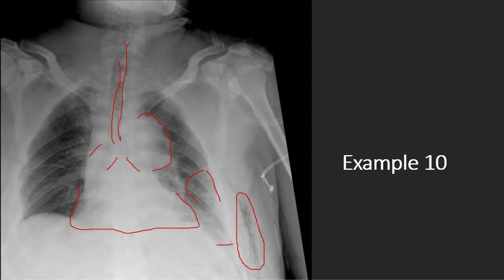You must put the finger or the forceps directly into the air spaces and feel or hear the whoosh of air. You can feel the lung with your finger when you put it in appropriately. And so this was an inappropriate placement because this generated a tract. And you'll see this chest tube went all the way up into the supraclavicular space. Bad times. And then this right here is the endotracheal tube right there. There's no central lines or anything that we can appreciate on this x-ray. Here's an electrode. So, when you put a tube in, you've got to know where it's at.